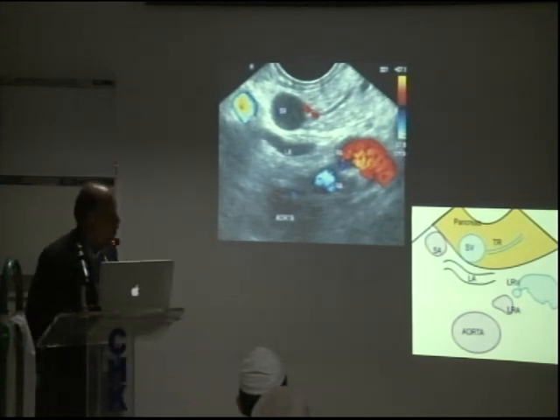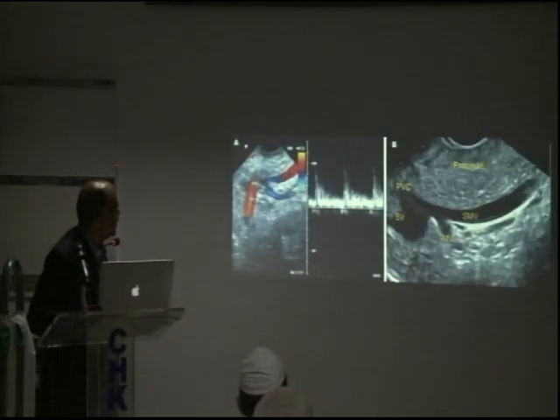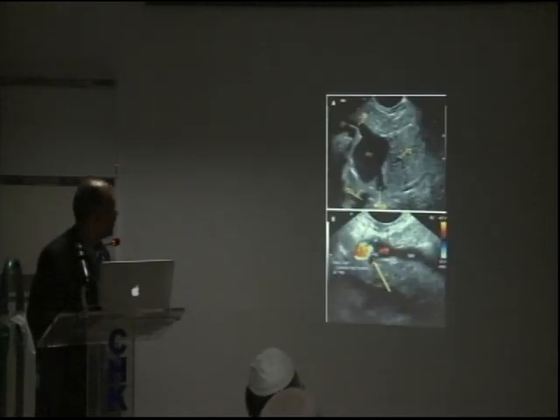All right. We'll just skip through because these are radial pictures, so we're not doing the radials here. Okay, look at this one.